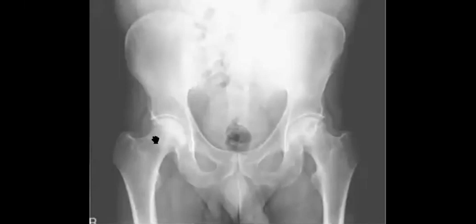So you will put avascular necrosis as the top differential. Then you will search for the other criteria for avascular necrosis, and then the cause of avascular necrosis. Here there is maybe subchondral lucency, maybe there is flattening in the right femoral head. You will mention the joint space is almost spared. This is important to mention. Then you will search for the cause. Patient history is more important. So what will be the cause?